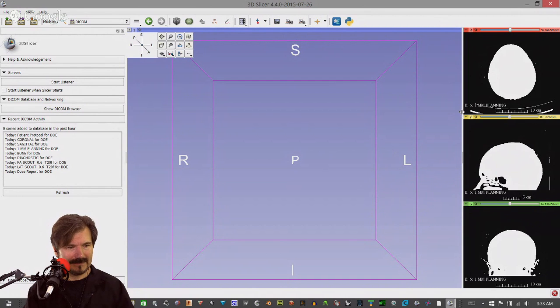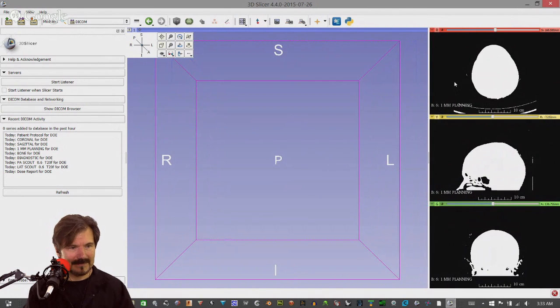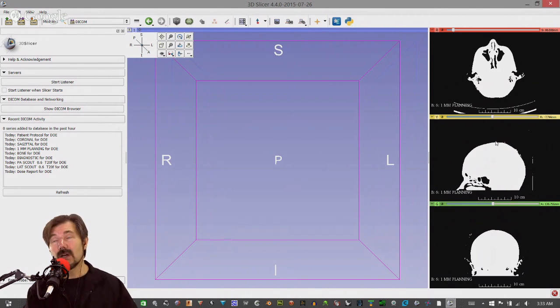Well, again, the 1 millimeter is just talking about the thickness difference between each CT slice. So usual slices, if you're in the chest or something, can be 2 millimeters, 3 millimeters. I picked the 1 millimeter specifically because I wanted to bring something with some good detail to it. And actually, we'll go ahead and write into a volume, and yes, you'll see the big difference.